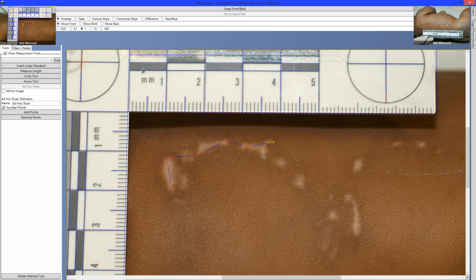And as you see, I am picking lots and lots of points. Pick some right there. 9 points ought to be plenty. Hit escape to stop adding points, and I'm going to name this the Bite Me ruler.